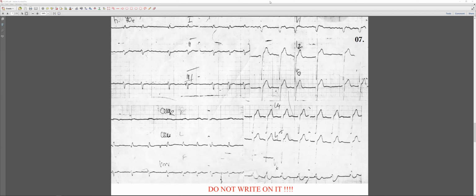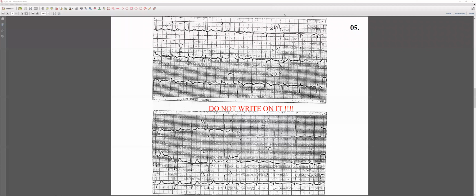Okay. All right. That's it. Thank you. You're welcome. Who is the next one? I'll try. Nasike. Okay, Nasike. Okay, I can find you a good ECG, Nasike. Okay, good. All right. Yes, the cursor is yours. Can you see it? Not yet. Left click first. Now I can see it. Okay.